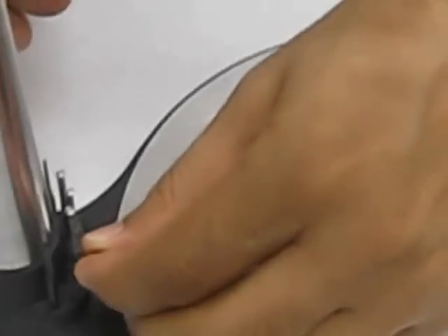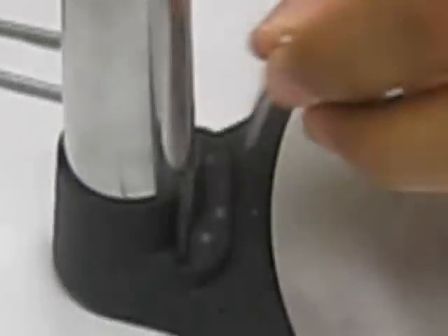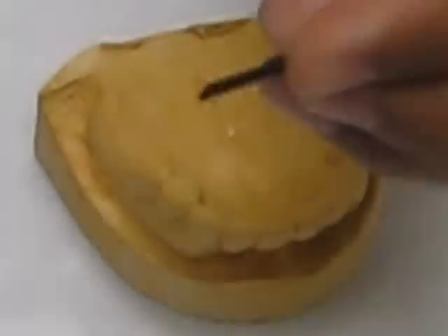Undercut gauges. They are available in 3 different sizes. You can identify the size of the gauge with the marking on it. One line is 0.01 inch. 2 lines is 0.02 inch, and so forth. And the last is the wax chisel, which is used to survey the crown.